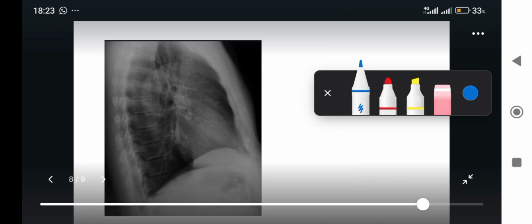In this image, we look at Hoffman sign, Hoffman-Rigler sign. We'll draw a straight line from where the IVC meets the diaphragm. Then at 2 cm from the junction of the IVC and the diaphragm up, we'll draw a line to meet the posterior border of the left ventricular wall.